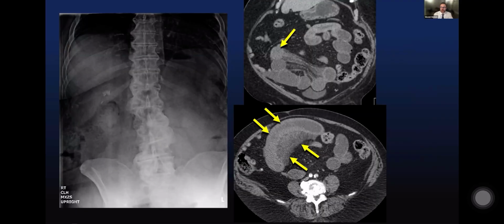Just to hammer home the importance of small bowel obstruction and ischemia, this is a patient who has a gasless small bowel on this radiograph. Again, radially distributed obstructed small bowel loops in the right mid-abdomen with high attenuation bowel wall thickening and high attenuation edema within the mesentery. This is actually mural and mesenteric hemorrhage from ischemia complicating a closed loop obstruction. Remember that hemorrhage within the bowel wall is one of the most specific signs for ischemia complicating small bowel obstruction.